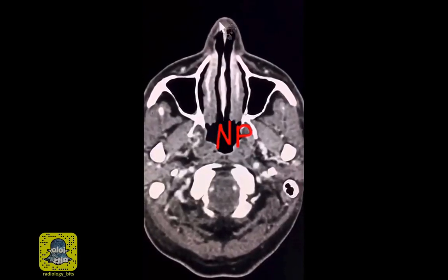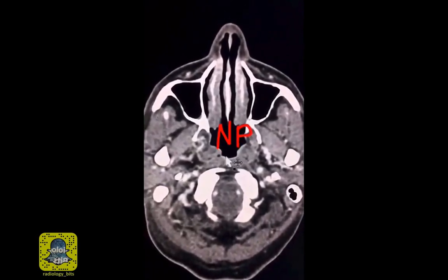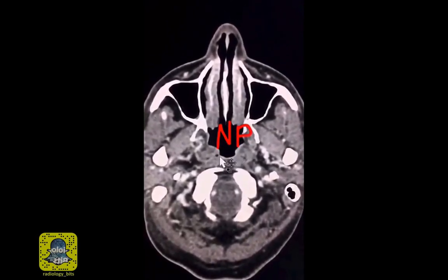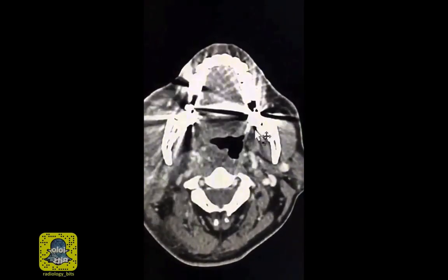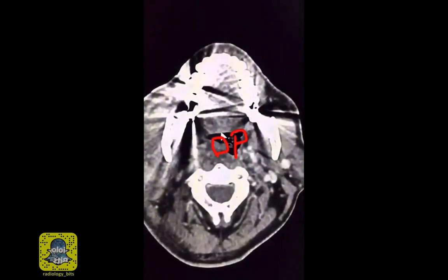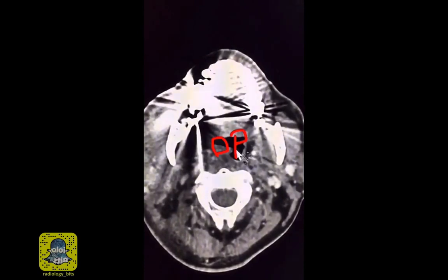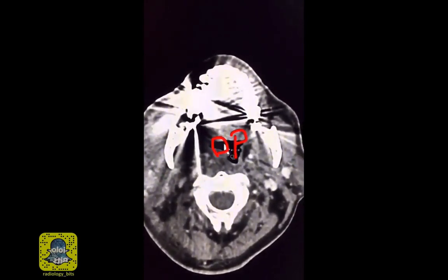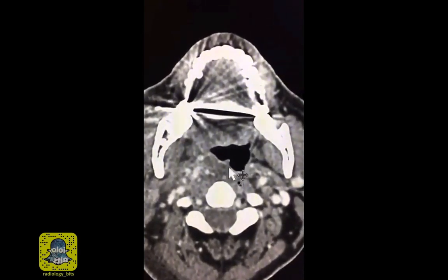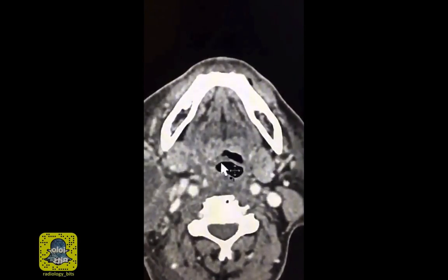This is the nose, this is the nasal cavity, and the space that's at the same level is called the nasopharynx. Scrolling downwards, you'll see another space that's opposite to the mouth. As you see, these are the teeth. In simple terms, this space here is called the oropharynx. So finish the nasopharynx, and this is the oropharynx. There is some distortion of the oropharynx that we'll discuss in details later. But let's go all the way downwards to look at this structure here.